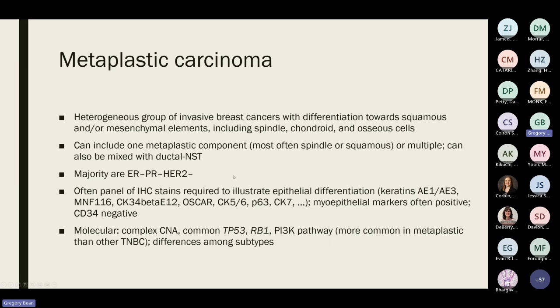Most labs have most of these, but not all. Myoepithelial markers can also be positive in metaplastic carcinomas, and CD34 is basically negative in metaplastic carcinomas. So it's one nice sort of rule out stain you can do.